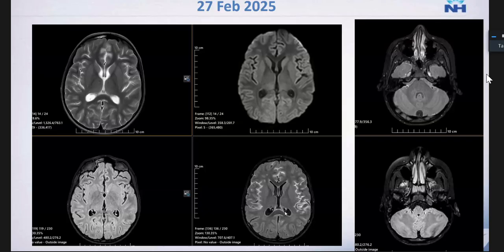Somebody was asking, can it be meningioma? Again, meningioma in the pediatric age group is not that common. When you are thinking of meningioma in the previous case, you should be very sure that unless you are dealing with some NF2, it's not common that meningioma presents at this early age. So in the previous case meningioma was not a differential, and as we have seen that multiple bones were involved, that also rules out the possibility of meningioma in those kinds of cases.